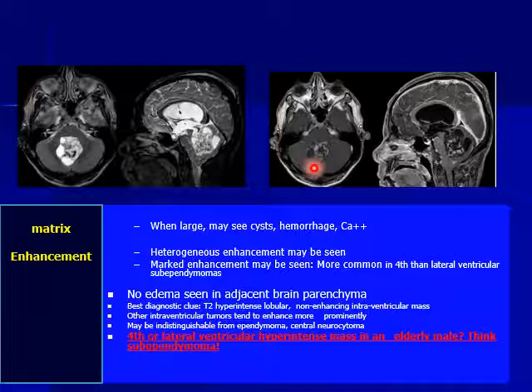Not shame at all to write a differential diagnosis. The main role of you as a radiologist or a neuroradiologist is to describe the tumor anatomically, where it is originating, what its effect is, what it is forming in the brain. Is it compressing or infiltrating the brain stem? What is its relation to the nearby structures? These are the items that the patient and the surgeons want to know.